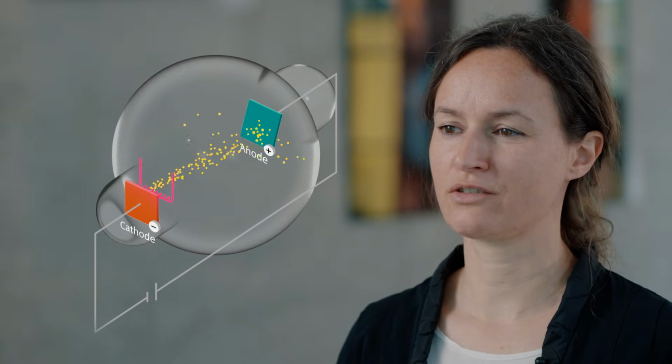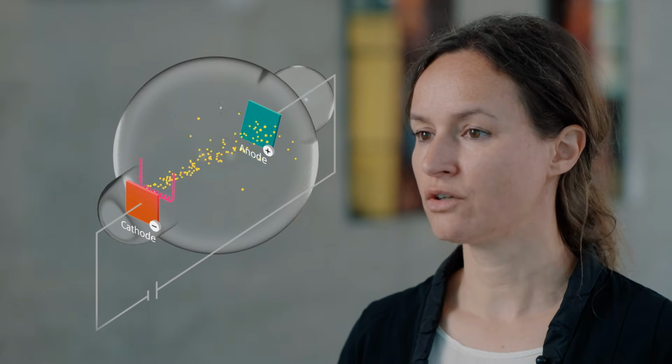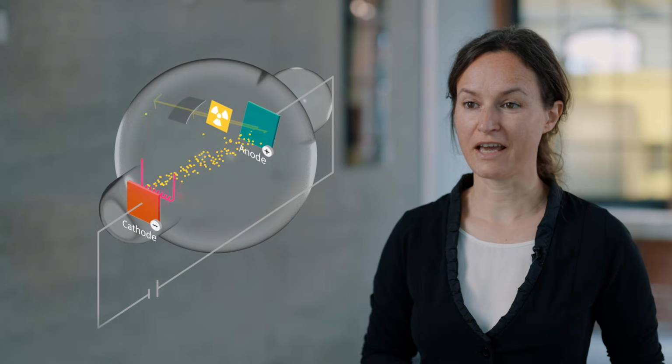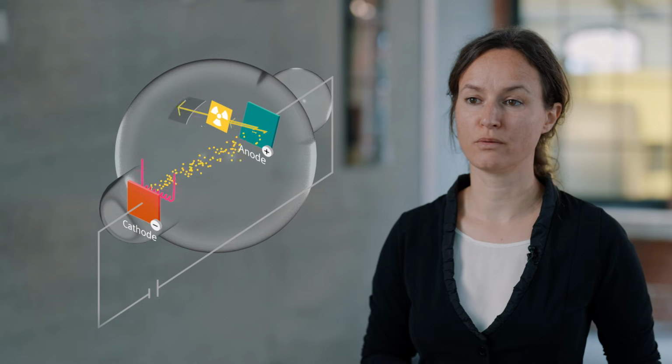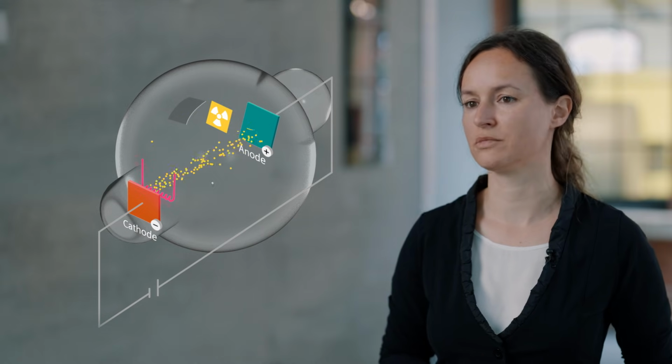When the fast electrons collide with the target, they are abruptly decelerated. During the sudden deceleration, part of their kinetic energy is converted into X-rays. The X-rays generated leave the tube through a special window and can then be used for medical imaging, for example.